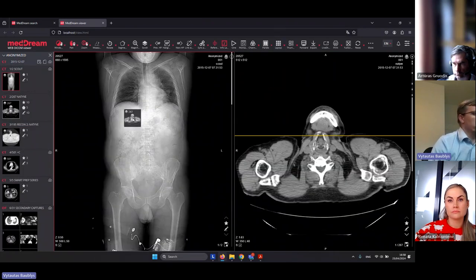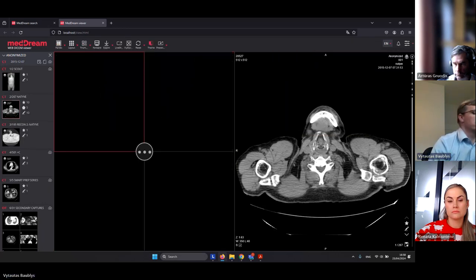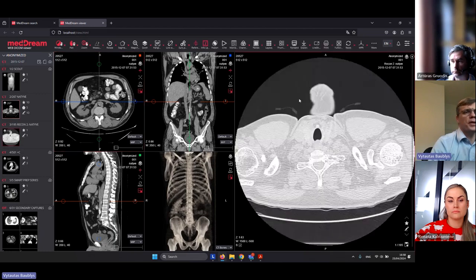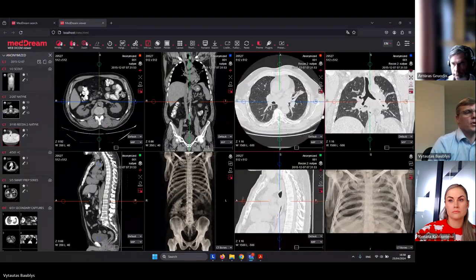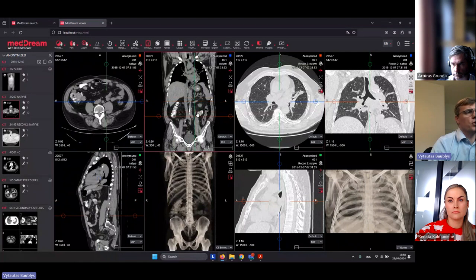So, for example, I put this series, create an MPR view, put a second series, and create a second MPR view. So I have 2 images. As you see now, I'm not able to do a crosshair because I'm moving only one selection.